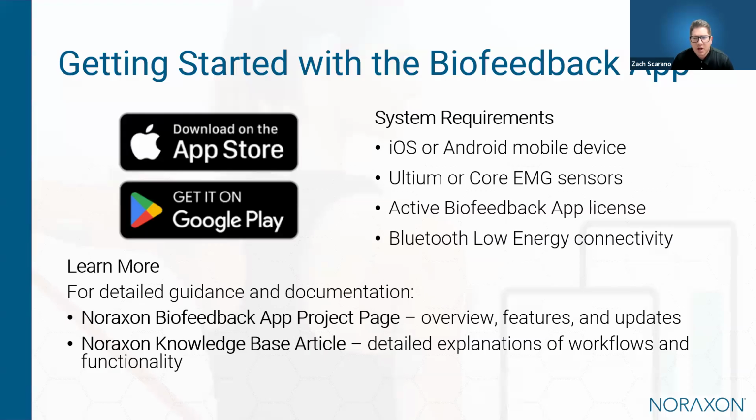And we've also published a knowledge base article that walks through the workflows and functionality of the application in more detail. Those resources provide a step-by-step explanation of the different training modes and reporting features that you saw demonstrated today, along with other key functions and options within the application.